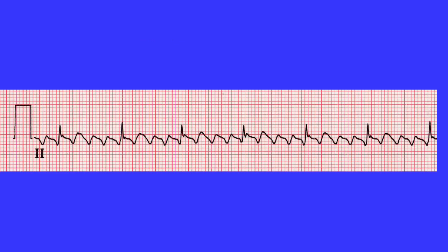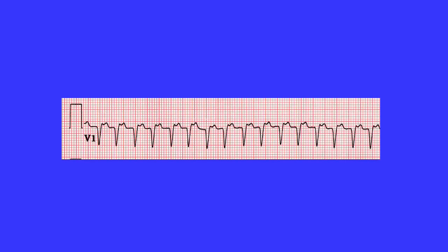In this patient, the P waves are replaced by what we call a sawtooth appearance of flutter waves, seen in atrial flutter. This is a narrow QRS tachycardia, but the P wave is just after the QRS complex and is known as supraventricular tachycardia or AV nodal re-entry tachycardia.